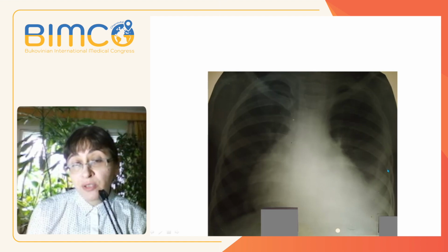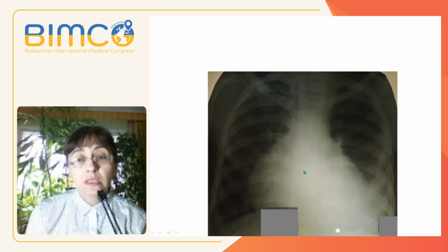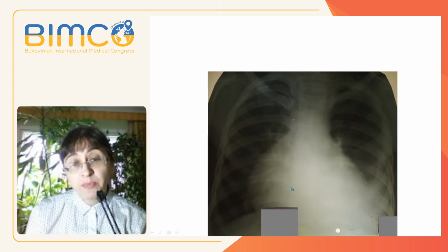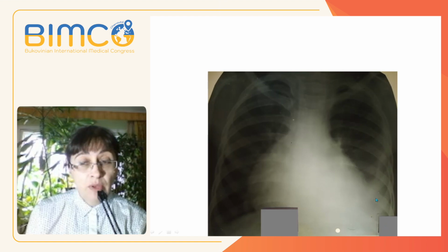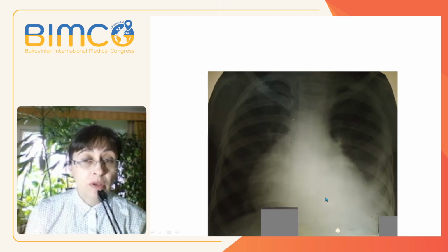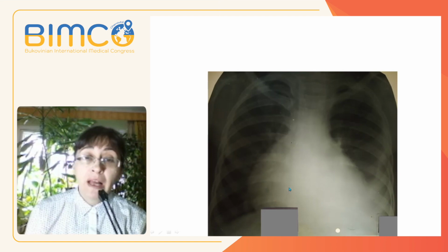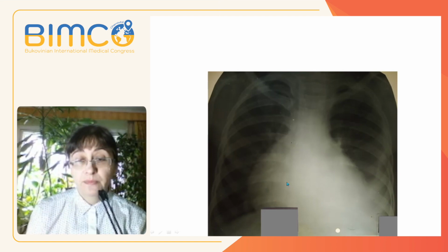Also, this is a chest X-ray of a 12-year-old girl presenting with dyspnea, coughing, and fevers for several weeks. We may see not only cardiomegaly, although this side is not visible, but we may suspect that the cardiomegaly is moderate. The not visible costophrenic angle on the left side tells us that we also have pleural effusion, and in this case a child having an autoimmune connective tissue disorder may manifest with such a syndrome as serositis, pleural and pericardial coinciding effusion.